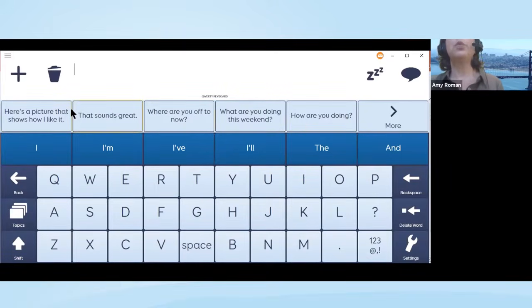And so this shows you the last couple things that you've talked about, but also you can type in a word, and we're going to look at this later. There's kind of two different ways to use chat history. Actually, let's just go over it now. So one way is if you've been speaking and someone new walks in and you've just explained something that just happened, and you don't want to have to type it all out again. You can use chat history that way.